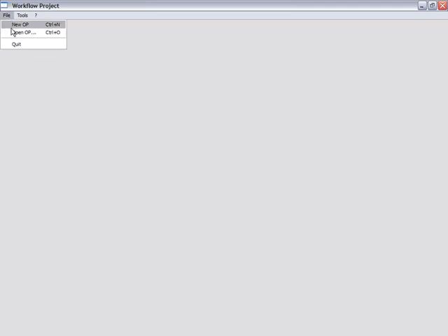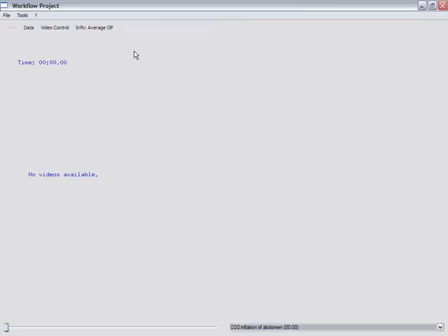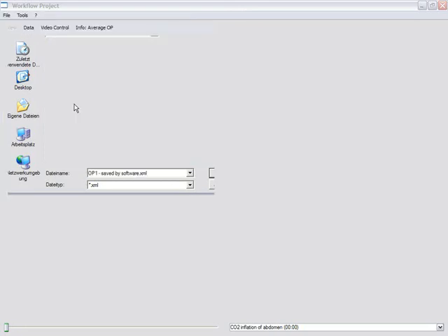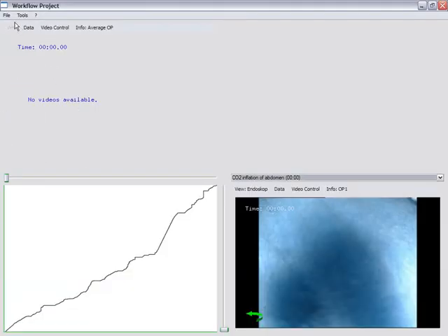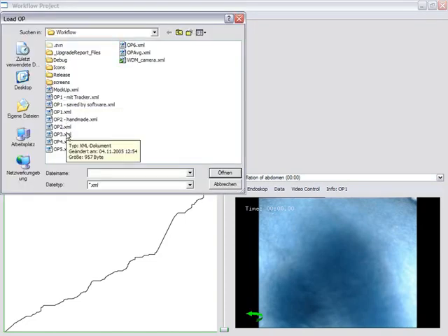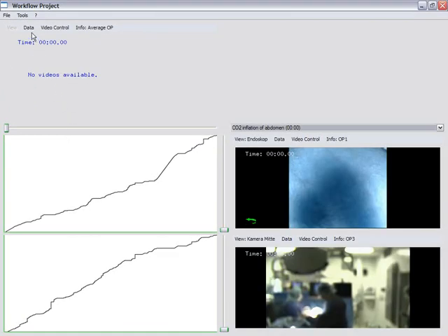Upon initialization of the software, an average surgery with workflow information can be loaded. Several surgeries from our database can be loaded for synchronized playback and workflow analysis. Timelines of average and original surgery are connected through the so-called dynamic time warp path, which can be seen in the left column.